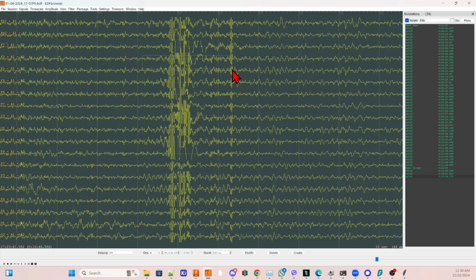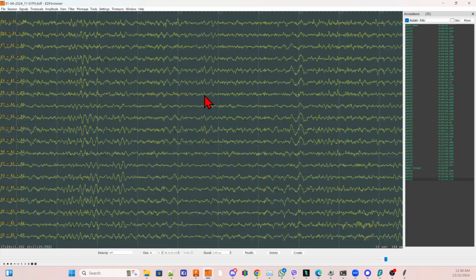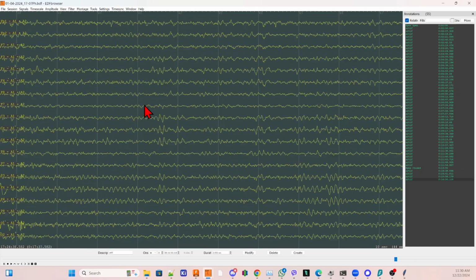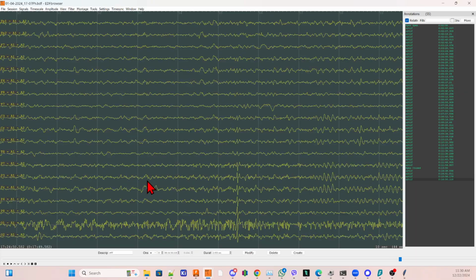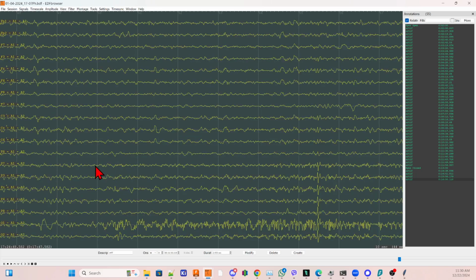This is definitely noise. I'm going to leave this. O1 is getting noisy here. Does it continue? It does not. So I'm going to remove it. This whole period. Bang.